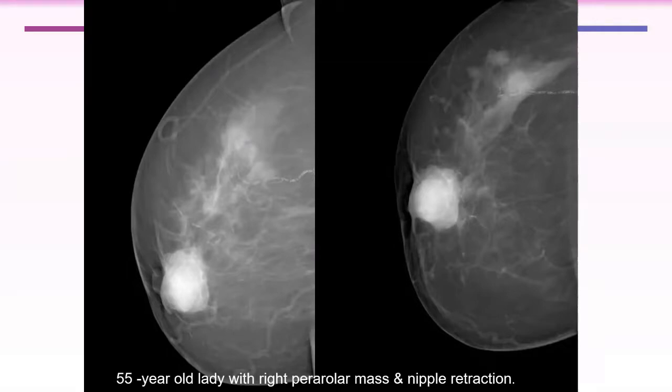Fibrocystic disease, maybe. Okay. But if you have a suspicious mass and you have other nodules, you have to think about multifocal and multicentric disease. You have to think about this first. Since the index mass is suspicious, you have to think about excluding multifocal disease.